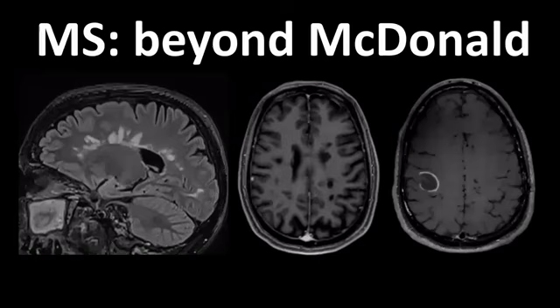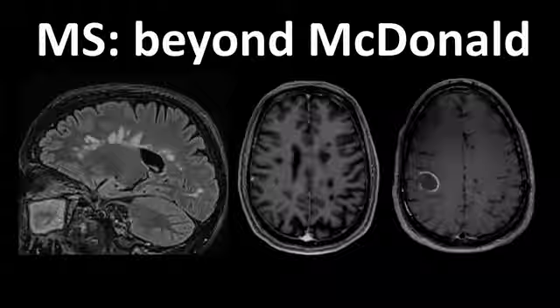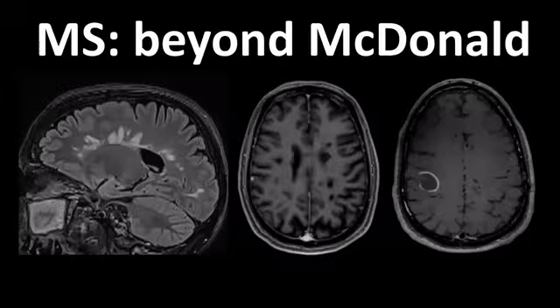And I'm going to start with some, well, I don't really know if we can call them signs or if they're more like minis. I'm going to show you some very typical imaging findings that should make you think multiple sclerosis. Now, you see that the title of this slide is called Beyond McDonald. We know the McDonald criteria.